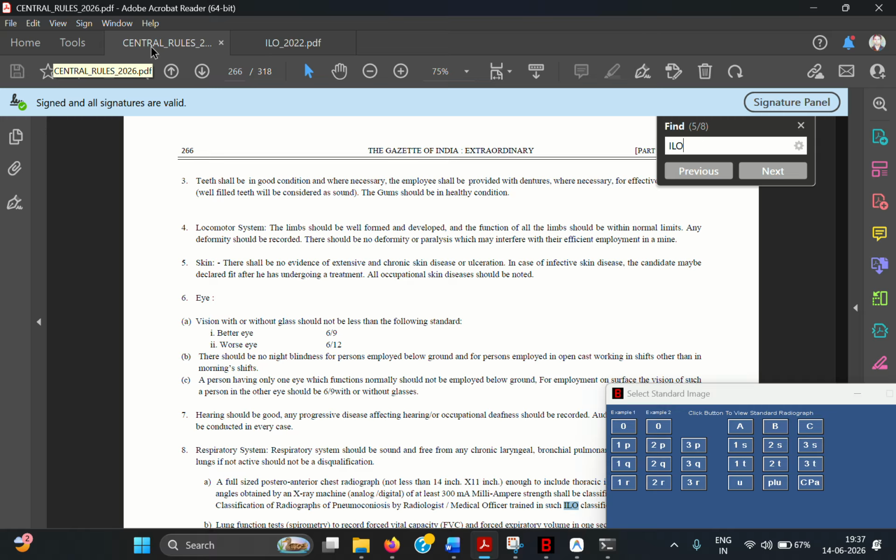It is to be kept in your local server. There are the DPDP Act and regulations, so data security is all related to your local server only. There will be no exposure of the DICOM image to an outer server.